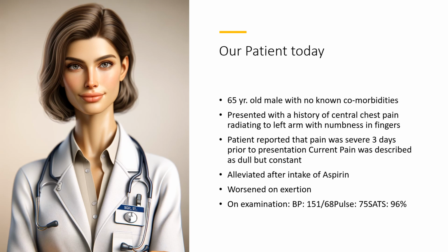It feels better after intake of aspirin. It is worsened on exertion. Now let's analyze the ECG that was done on the patient. His vitals were stable. See if you can guess the answer before the analysis is completed.